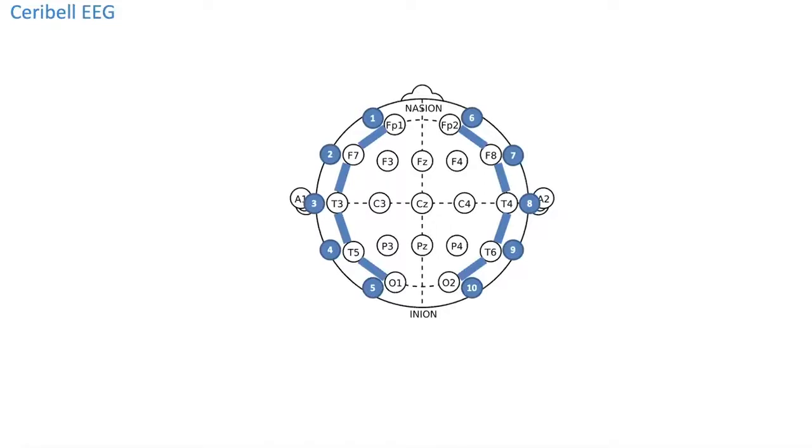As you will hear later, every channel of EEG is basically the electrical potential that is collected between 2 electrodes. So the difference between the electrical field in 1 versus 2 will give rise to 1 line of EEG. So you will see 4 on the left and 4 on the right.